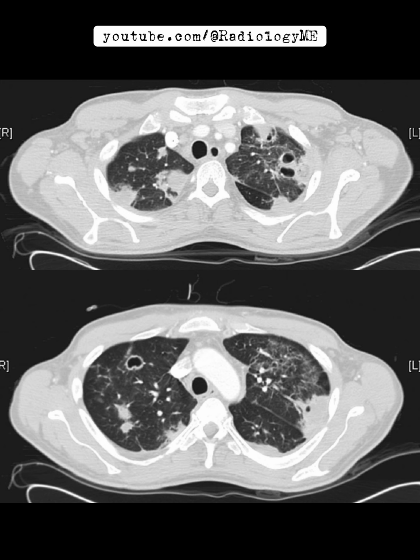This vasculitis can cause cavitating lung nodules, and in a younger patient like this, it fits quite well. Metastatic squamous cell carcinoma, not as likely in a young adult, but it's on the list. Rheumatoid nodules, possible but less likely considering this patient's presentation. So, given the findings, the diagnosis that fits best is Wegener's granulomatosis. The nodular cavitating lesions are typical of this systemic vasculitis, and the clinical symptoms of haemoptysis align with pulmonary involvement in Wegener's. It's also supported by the fact that pulmonary vasculitis can lead to hemorrhage and cavitation.